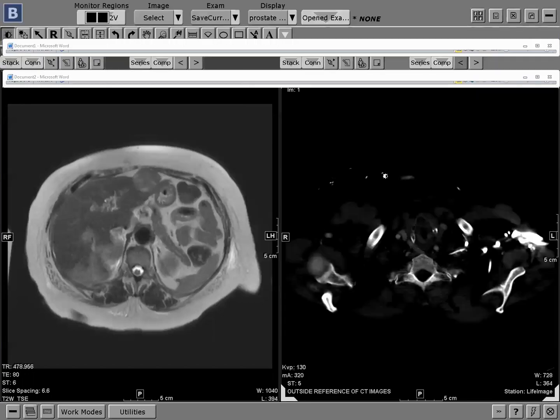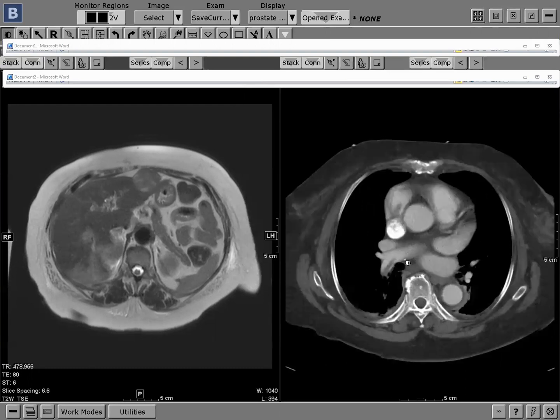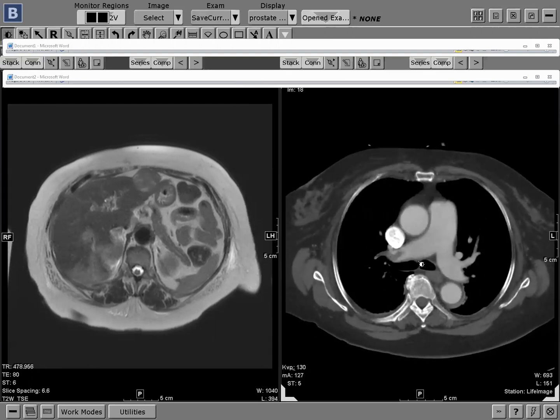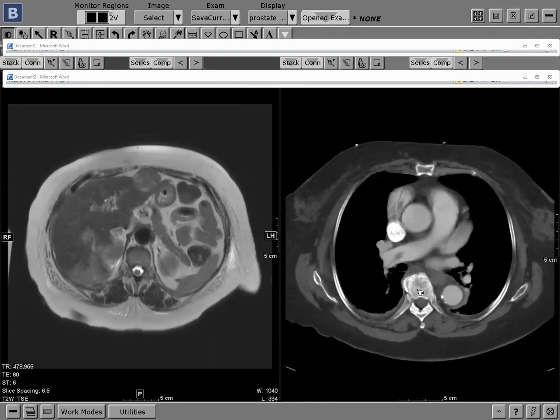Okay. So this is an uber interesting case. This patient came to us, was referred to us. This is outside imaging. You can see a huge PE. I honestly don't know how the patient presented to the outside hospital, but they were transferred with this big PE.